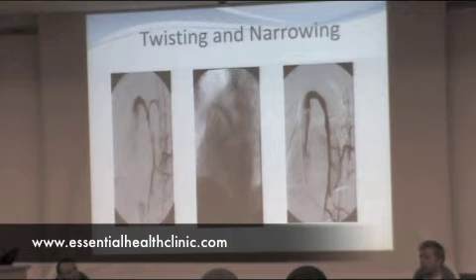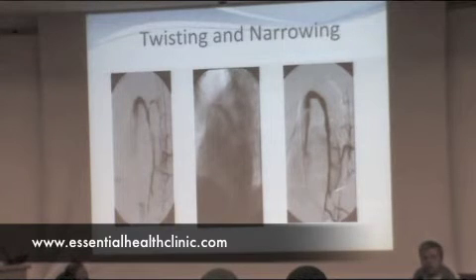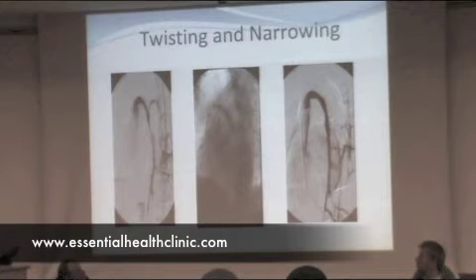A similar thing, very tight narrowing here and the collateral formation. This is post-angioplasty. Still there's a reflux down into the left renal vein and into the spinal cord, but it's much better than before. In this case, you have two options, either to stent or wait and see.